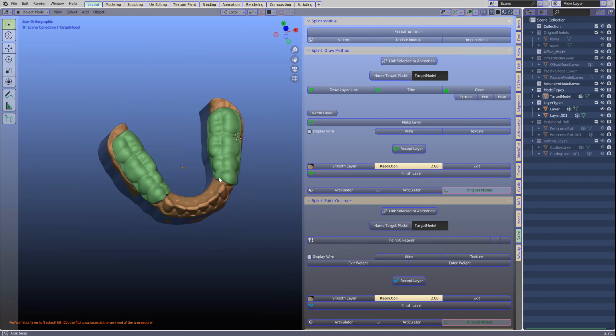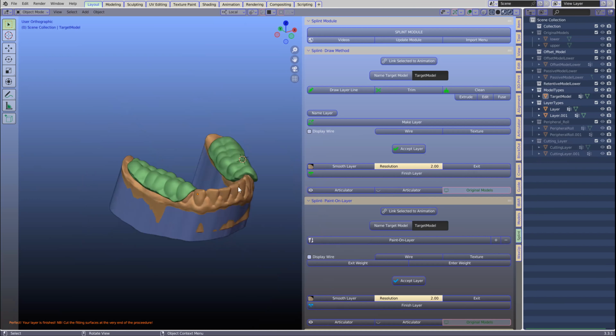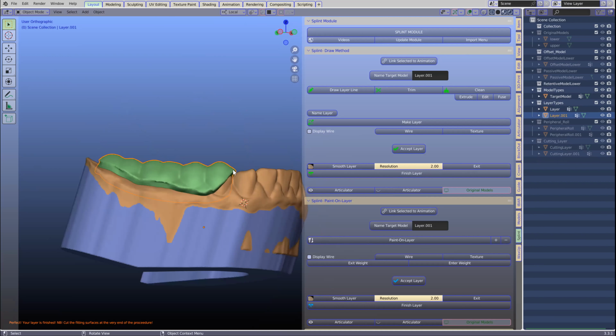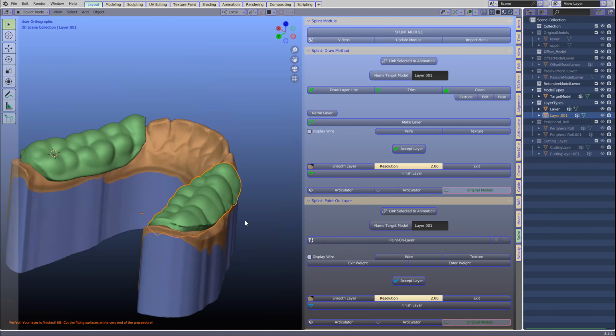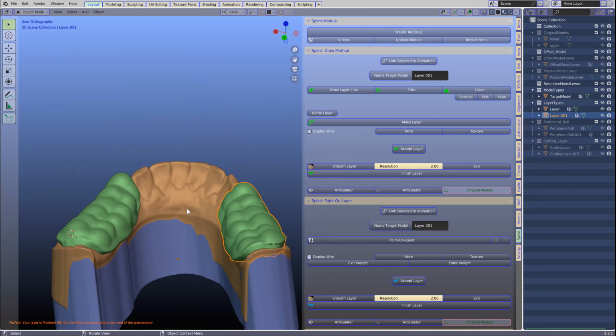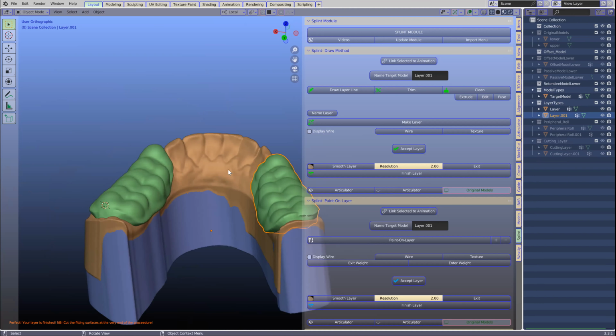And you're going to put a bar in there or something, isn't it? Is that correct? Can we design it with a piece of plastic as well, I guess? Like just pre thin enough. So you want another layer here or something? Yeah. Okay, so we can do the same thing, or we can have a combination of two.